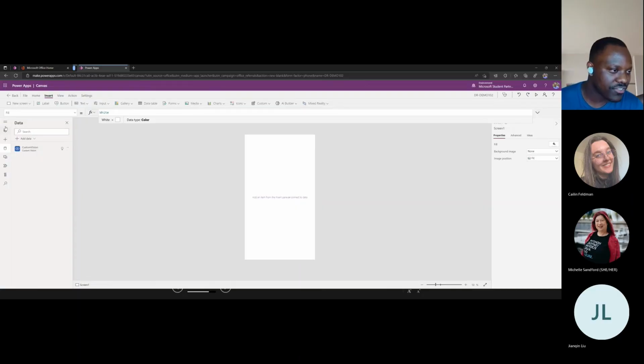So on this screen, I'll just go back to the tree view. And let's say this would be the screen for uploading. So what you're going to do is actually upload an image. We're going to upload an image, and that uploaded image will then be sent to the custom vision model, and then tested, and then the results will be reported on the Powerapps. And so we would see what is the recall, what is the precision on this side.